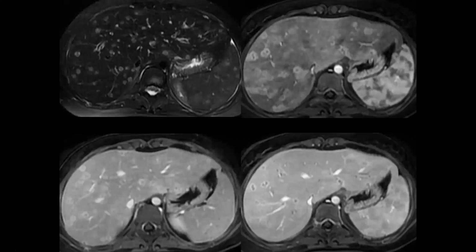Sometimes abscesses might be very small. We call them microabscesses. Microabscesses can be due to a pyogenic or bacterial cause, or can be due to fungal infection, especially in immunocompromised patients. This is a patient with leukemia. If you look carefully, this is an MRI. These are T2 weighted images and T1 weighted images after contrast. You can see very carefully these tiny dots with ring enhancement in the liver. And if you look carefully, there are also small lesions in the spleen.